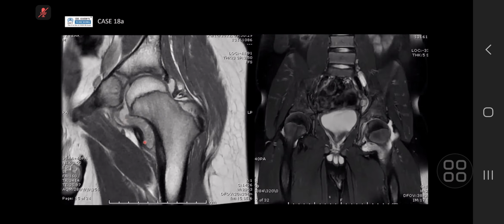So it can be grumbling for quite a while, and then it's incidentally picked up. So it's this synovial proliferation that's quite marked, and the absence of marrow edema. Often in septic arthritis, there will be some extent of marrow edema, and of course, prolonging it without treatment, you start to get more in the way of bony destruction. Yeah, because of the inflammatory process.